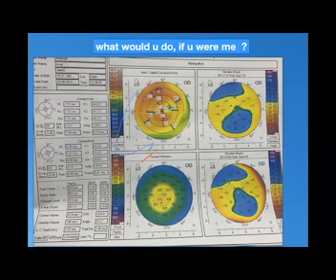The y coordinate is -1.2, right? The elevation is within the accepted range. Anterior elevation in the superior, this is the OD, the right eye. So the nasal part has high anterior elevation, but the back elevation is good.